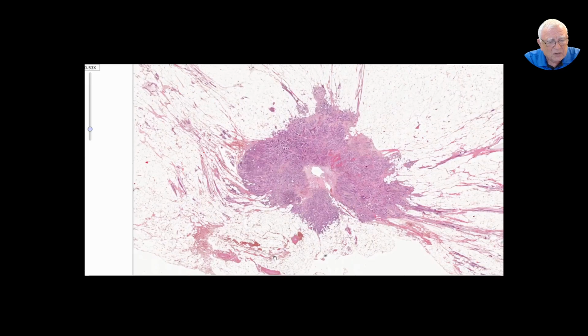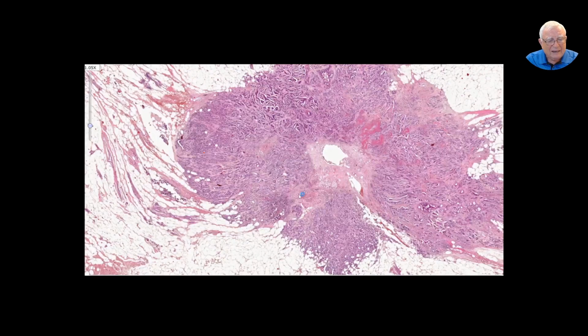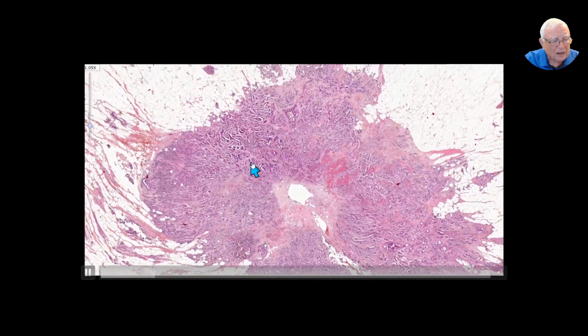What's the size? Think about the mammogram. I take the largest distance and it's maximum 10 millimeter. And from there to there could be 8 or 9. So let's try to travel around. Already at this time point, I'd like to call your attention that there is an intratumor heterogeneity.